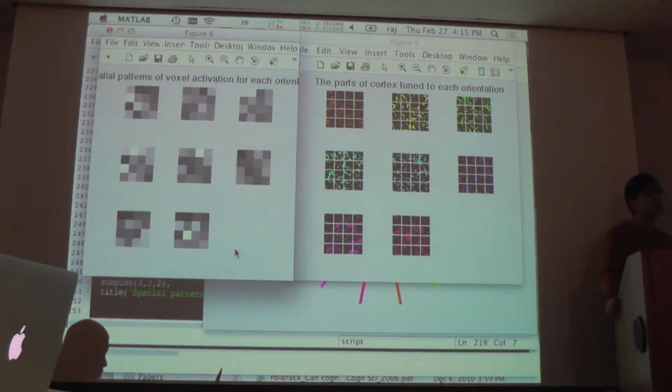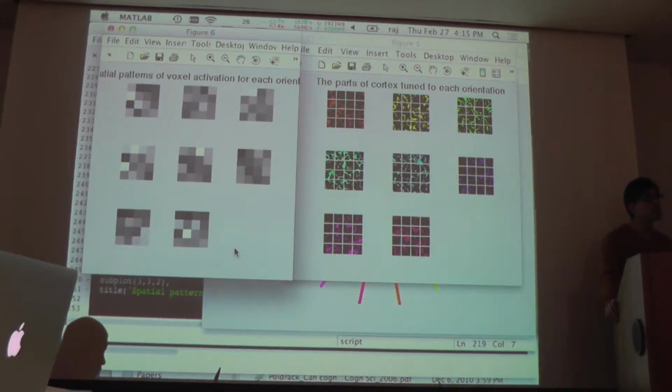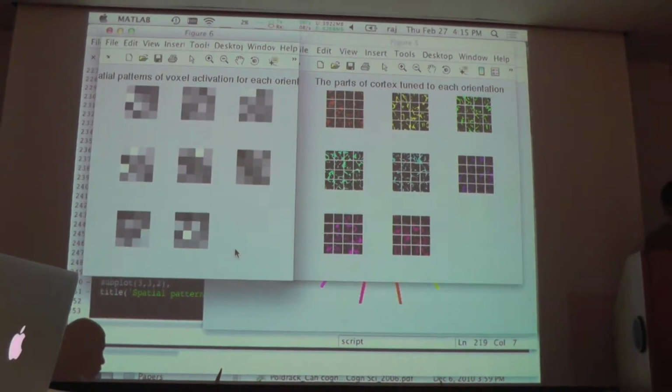So these patterns emerge over the mean of many trials. Right. So on a trial-by-trial basis, you could have any pattern available. So this wouldn't help us on a trial-by-trial basis, just as a mean across all the runs, I guess, at the end of the experiment? That's a very, very good question. Well, it depends how noisy each individual trial is. And actually, one of the things that we're going to do in a minute is add some fake noise to this. And this is actually an open question.